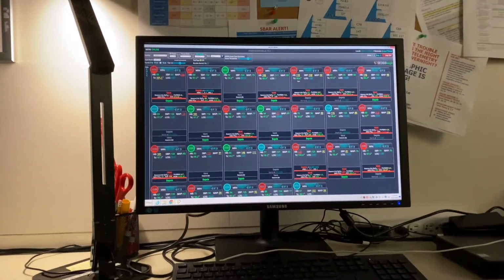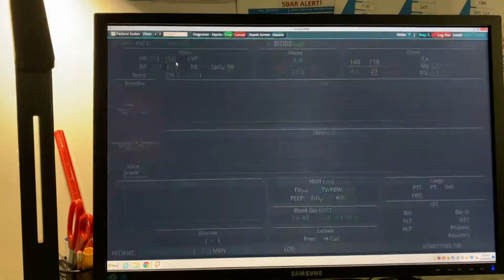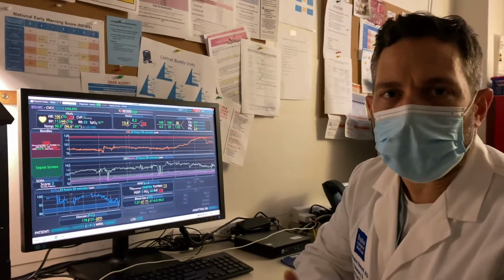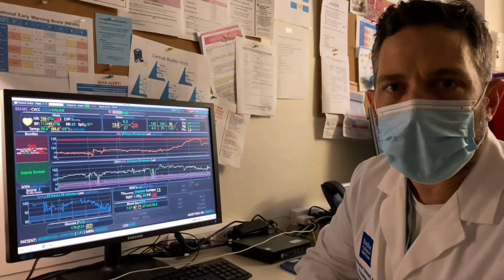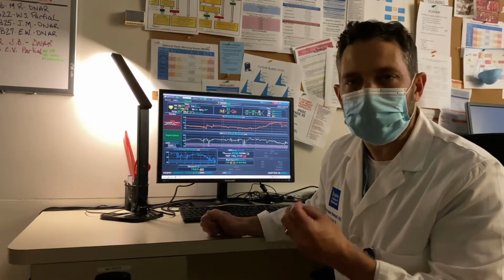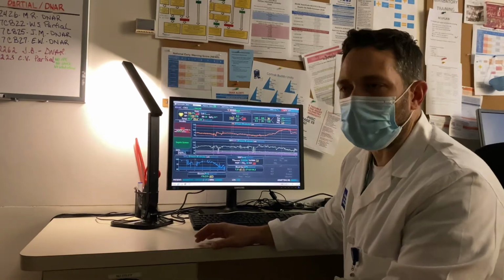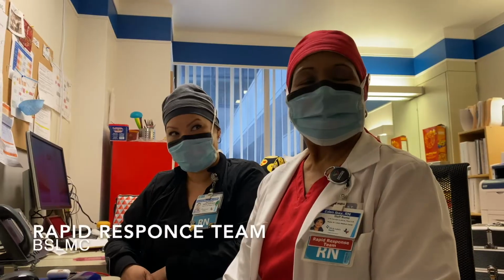And if I see one of these red alerts, I simply can click on that screen, and it helps me do a deep dive on the patient and what exactly the parameters are that are concerning. This again gives us an overall snapshot of the threats the patient may be facing, but it also helps us do a deep dive on any particular areas of concern. A tool like this is so critical to help us boil it down to just the essential elements. What is going to help my patient get better, but what's also going to help them from being exposed to safety events, decompensation.